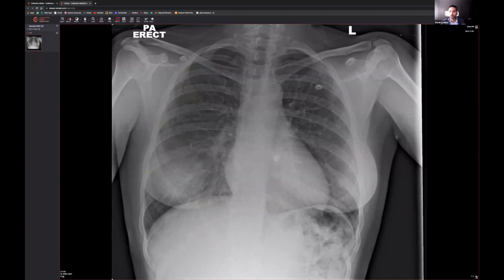Okay, so the ribs don't look quite right. The posterior aspect is completely, you just can't even see any sort of outline. And you may think to yourself, well, that's because the consolidation is covering it, but it actually isn't. Even if you've got consolidation, you should still be able to see a bit of normal cortical edges here, but there is no cortical edge here. What it turned out to be was actually a destructive chest wall lesion causing destruction of the posterior rib.